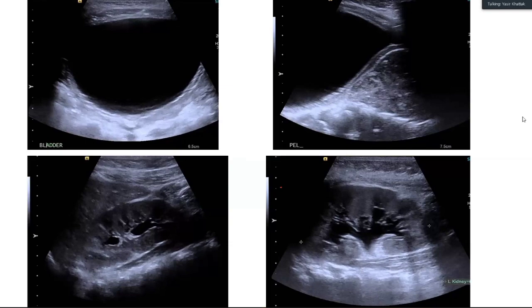So let's say it is not rhabdomyosarcoma. What is the closest differential of rhabdomyosarcoma? Sir, lymphoma. In retroperitoneum, lymphoma will be a bit less likely, you see. But if I'd ask you, do you think sacrococcygeal teratoma in a child? Yes. Right. So always think about the location and then give your differentials. Just like you said kidney and you straight away mentioned Wilms and neuroblastoma. When you say retroperitoneum, don't mention lymphoma straight away. You mentioned sacrococcygeal, so you can also have neuroblastoma in this.